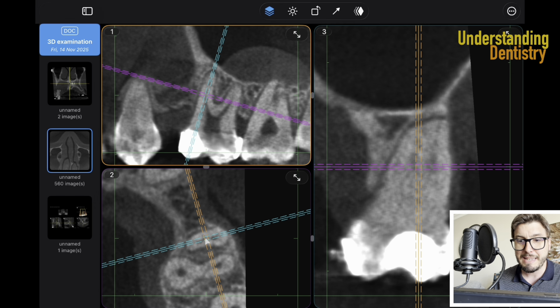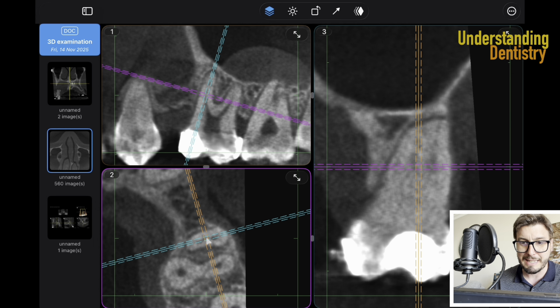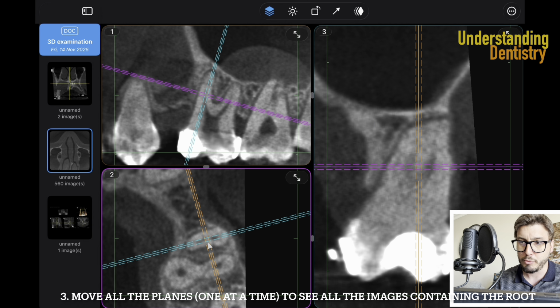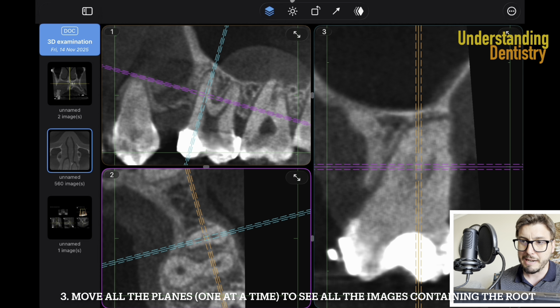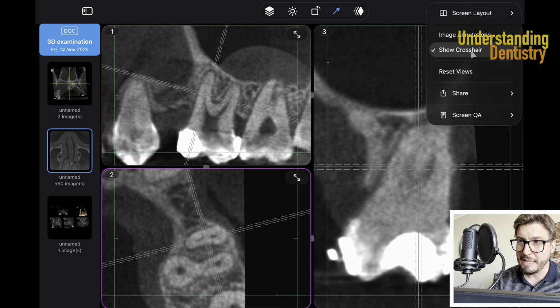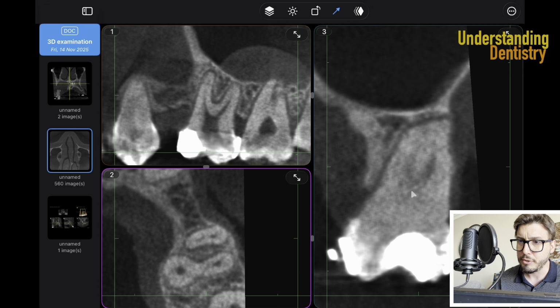And now I already see both root canals. They are not exactly wide, they are actually narrow. But okay, so let me move now the axis to be a little bit more parallel, and look at this. I can see that they start here, and let me remove now the axis for you guys to see better.